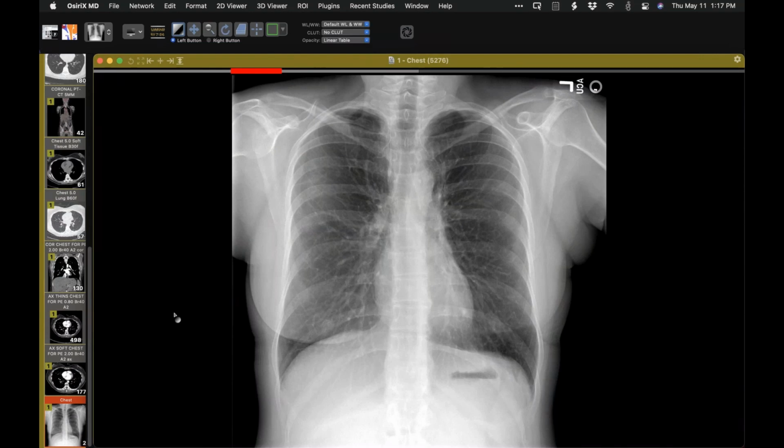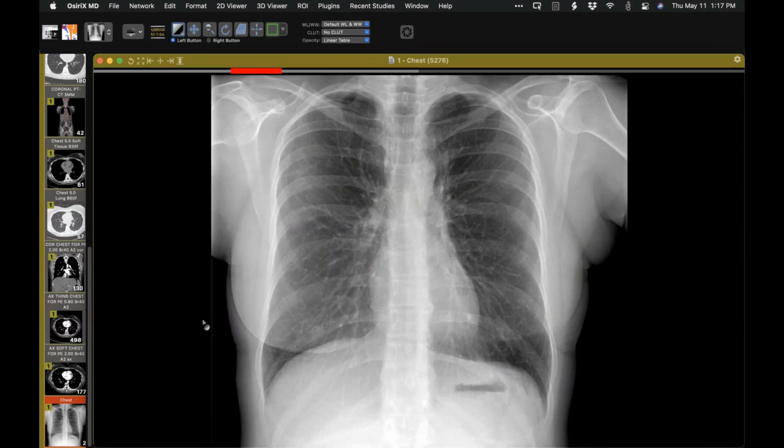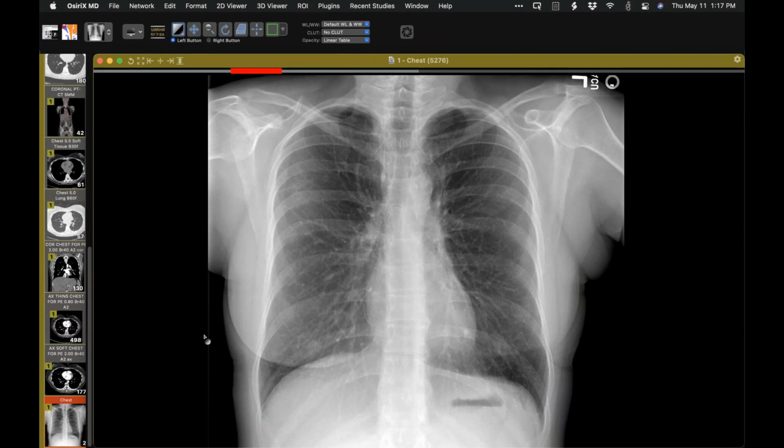So I'll give everyone a moment to look at that image. And the findings, of course, are subtle. Let's see if you see anything. Potentially the left hilum looks off. I don't see the aorta well just above the arch. The aorta, is something wrong here? Maybe. Looks like lucency. I don't know if it's a Mach line or something right there. Too busy.